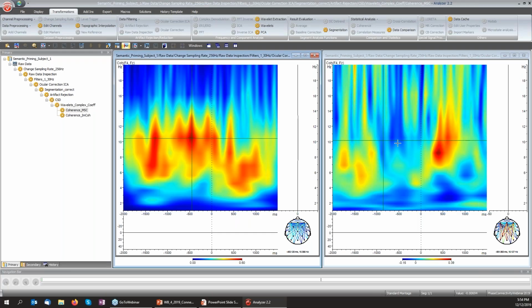When switching to the imaginary part of coherence, we can see also that these connections are now visible across the whole head and not only locally strong. So that we can now see those connections could be explained because the large coherence values that come from volume conduction effects are now strongly attenuated and other real connectivity values are uncovered.